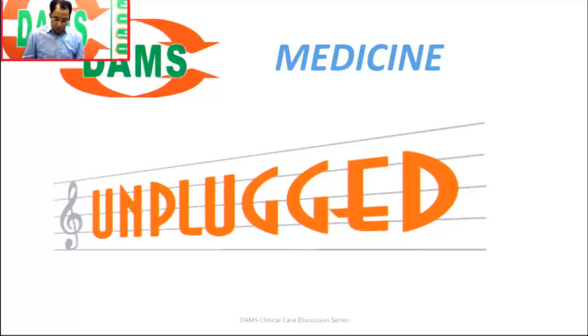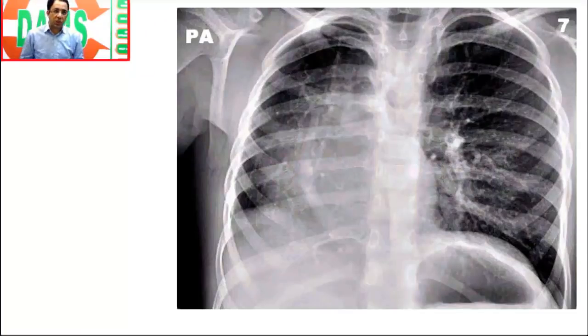Now today what I am doing is I am going the reverse way. I am going to show you a chest X-ray, and I am asking you what is the diagnosis in this X-ray. Usually, as a radiologist, I see this X-ray in my routine practice. What do you think are the outstanding features?